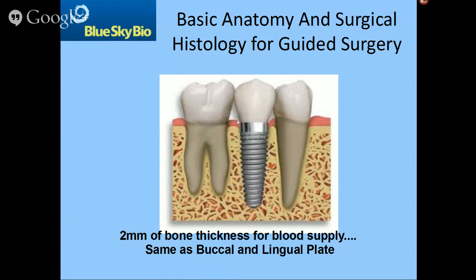Besides, you really need a little more than that just to get the proper emergence profile of the tooth coming up out of the implant as well. Getting too close to an adjacent tooth is not a great idea, because of course the tooth that's next to it does not have a flat profile. It also has some emergence profile and some shape to it. You're not dealing with flat planed objects. I forgot the video game that's all squares. I think it's Minecraft. I'm sorry, I don't have teenagers anymore in the house, so I don't know the names of video games. We don't live in a Minecraft world, so we have to account for shape and profile and so on and so forth. So a minimum of 2 millimeters is a good number.